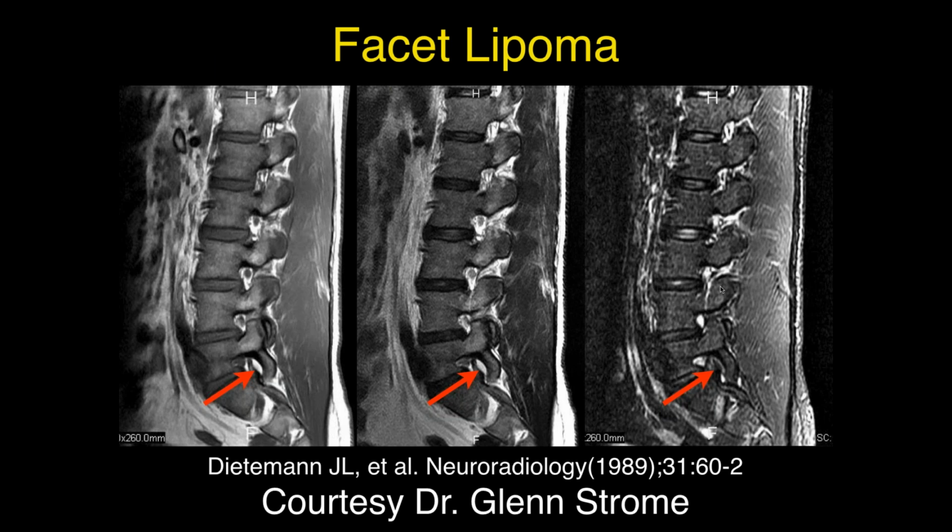They're pretty rare. I'm sorry, I thought this was a cyst. No, this is actually fat in there, and there's a little lipoma within the facet joint. Well, you see, I'm the orthopod, and I don't know all those things like lipomas. Right.